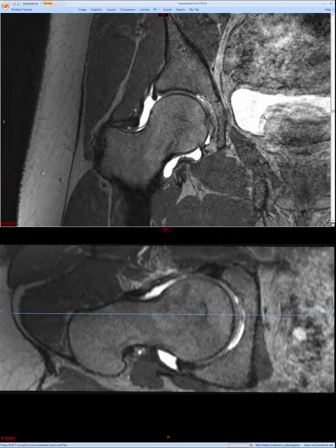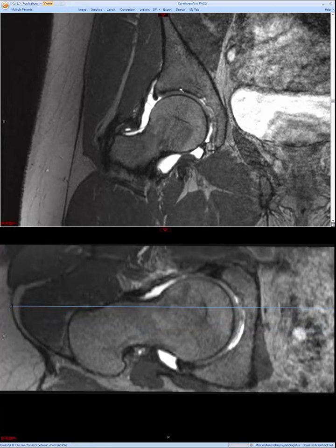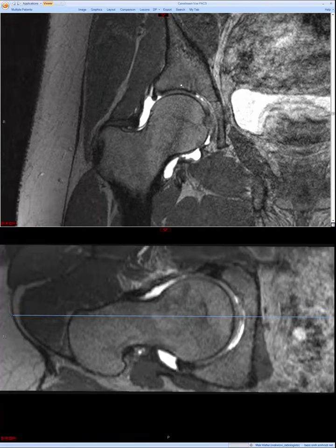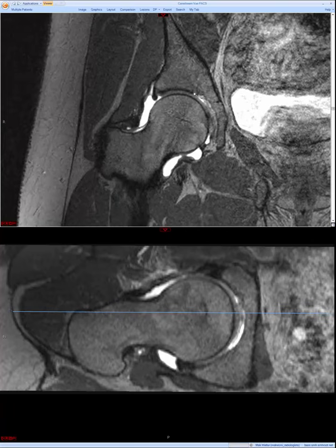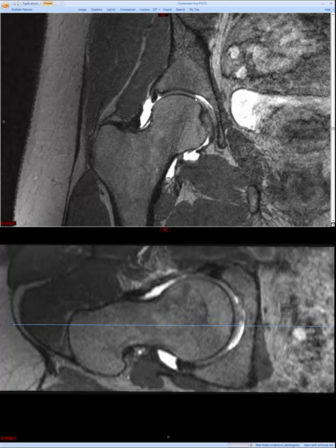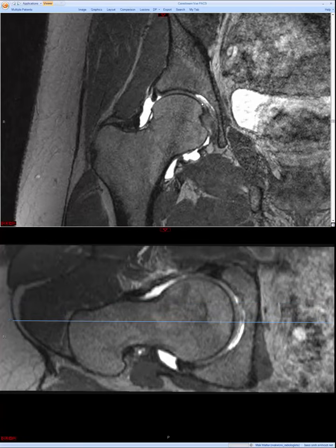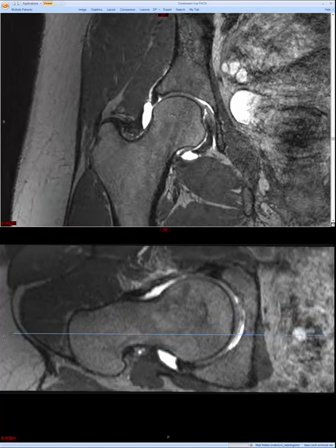Another pitfall is that you may see apparent defects in the superacetabulum, and these are the supraacetabular fossa, and then more medially a stellate crease, or supraacetabular crease, I think is what they call it. And I think it's just a matter of seeing one or more of these to learn how to distinguish these from true osteochondral lesions of the hip, which are not nearly as common as those in the knee.